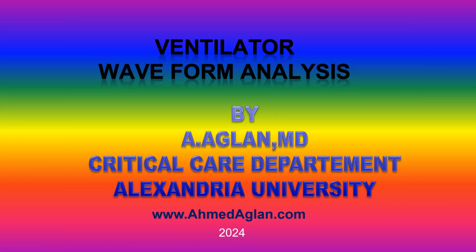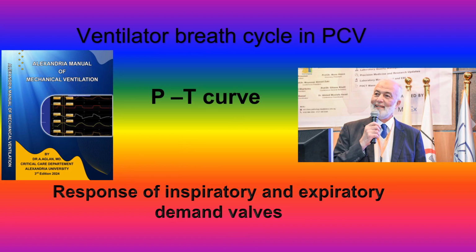Ventilator waveform analysis. Ventilator pressure cycle in pressure control ventilation, or we can say in another way, the pressure delivery by the ventilator to the patient during inspiration in pressure control ventilation. And this can be analyzed by studying the pressure-time curve and at the same time seeing the response of the inspiratory and expiratory demand valves, when they open and when they close.